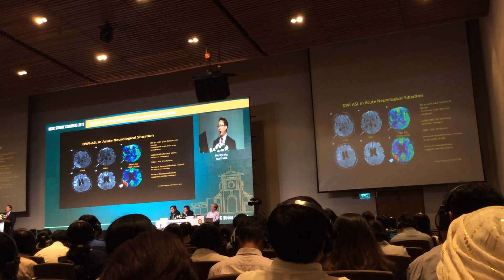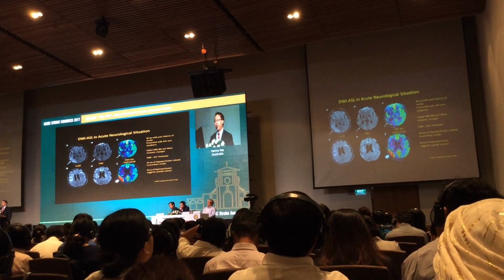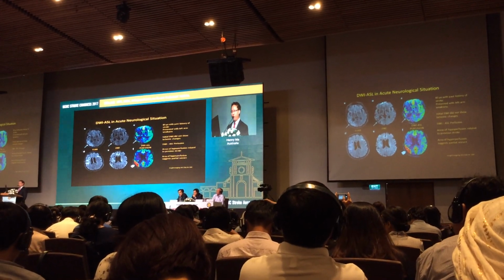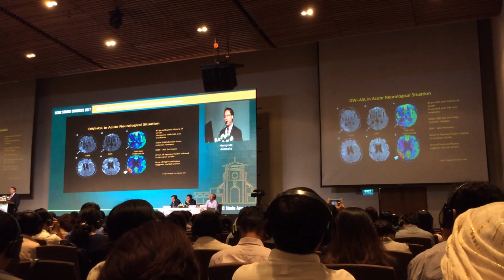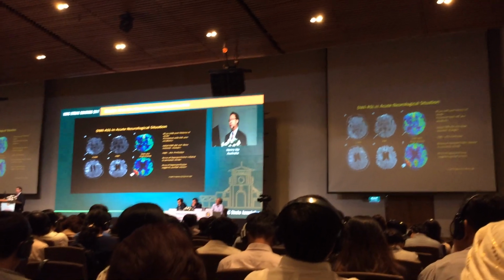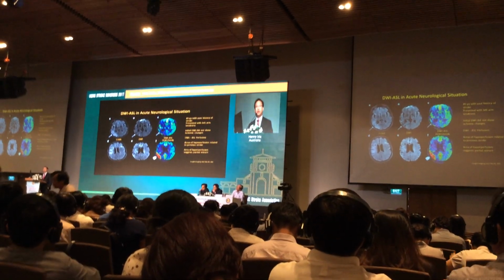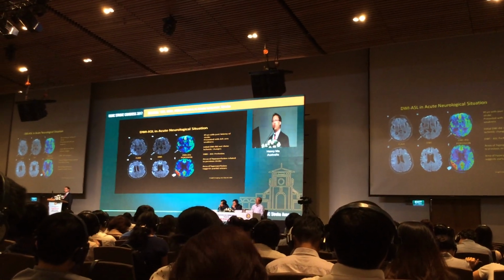So another patient, 85-year-old, with an old infarct in the right posterior region, as you can see on the FLAIR, and the DWI, which is not bright. You can see lack of perfusion over that area when you overlay it. But then later, when you do the perfusion again, you can see this bright red area of hyperperfusion. It's because this person is having a partial seizure secondary to the old stroke. So perfusion helps with that, and DWI helped you to tell there's no new lesion.